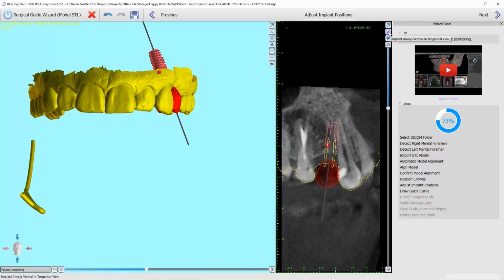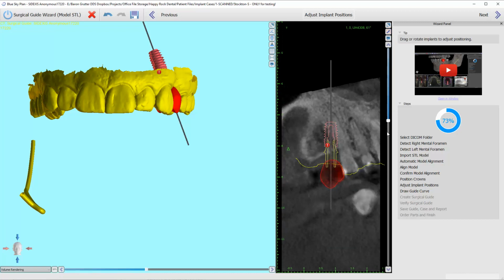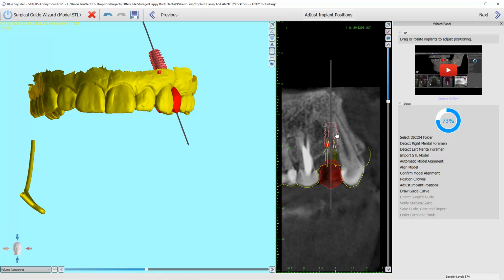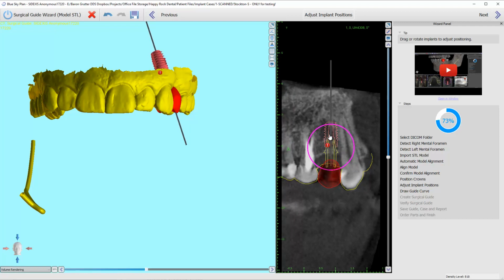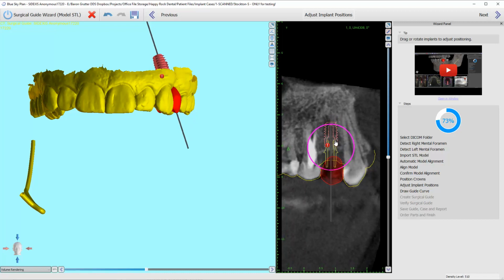I like this button right up here, which is going to keep it upright, and it's going to make the whole mouth swing around it. Okay, so let's go ahead and rotate this. This just tells me that I should have rotated the virtual crown a little bit. Again, that doesn't really matter as long as I'm centered within the cusp. That's kind of what I'm looking for. I like this depth interproximally, but I might have to go deeper based on the buccolingual bone volumes. But you know, this is a starting point.